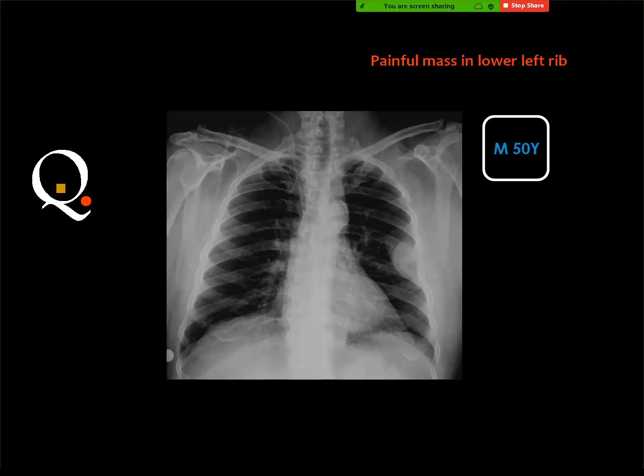Assalamu alaikum. Alaikum salam. Chest X-ray PA view showing a focal lung lesion of an obtuse angle, oval shape, radio-opaque density based on the left lateral chest wall from inside, denoting that it could originate from the pleura because it has an obtuse angle with the surrounding lung parenchyma. Yes, very good.